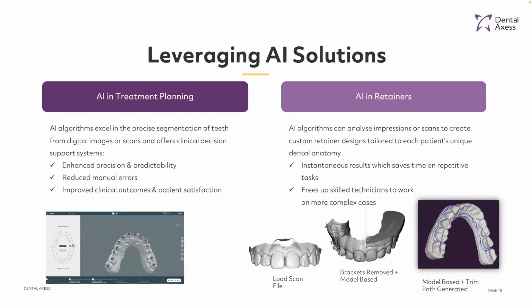And then it also currently facilitates automated stepping. That's just one of a few features that the platform has for you. But the AI-driven features will save time in your process in planning and for Dr. Tania as well, but also improve the precision and efficiency in treatment planning.